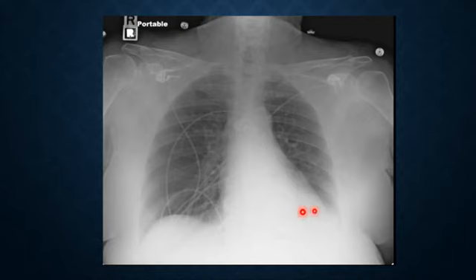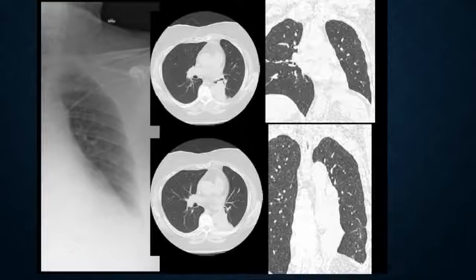You can see the left hemidiaphragm. Where is it? Absent. Good. And when we have a CT scan, you can see obviously collapsed. What? Left lower lobe. Good. Now, every lobe has its own features. We've seen most of them, a lot of examples of every lobe.